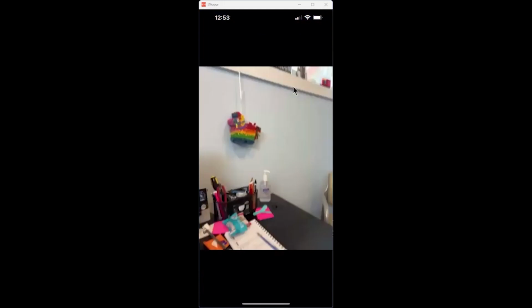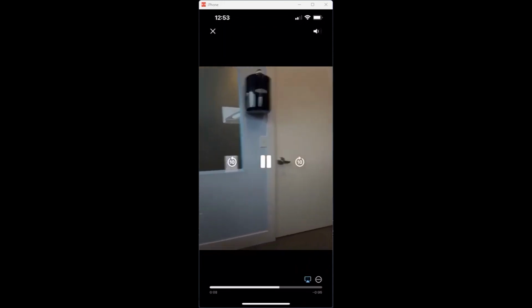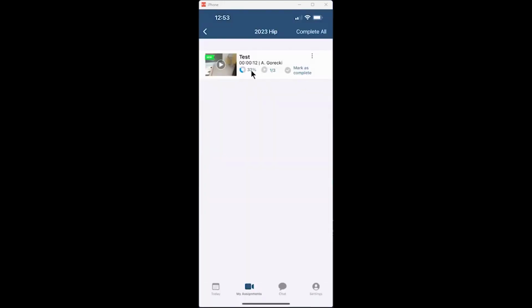If we pull up the video, so we're just going to say, okay. Here it is, very simple. In the doorway, we've done 5 repetitions of 30 seconds. The patient watches the video to completion. And then that video gives them credit for 33% of the daily assignment. Again, we can hit mark as complete as well. So that's for the day they marked as complete.